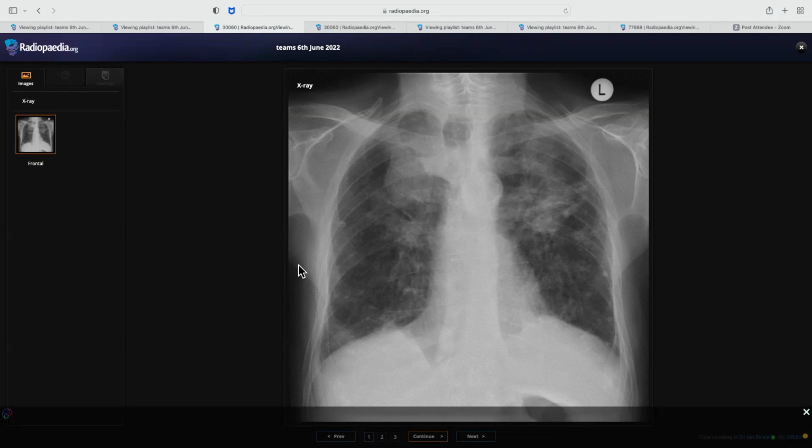So in summary, we have reduced lung volume with bilateral upper lobe ill-defined confluent opacities, and progressive massive fibrosis is a possibility. So I will correlate with the clinical findings of the patient, if he is a known case, to rule out exposure to occupational dust, and correlate with any previous examinations to see the progress of this case. I can also notice some tracheal dilatation, which denotes the chronicity of these findings. So progressive massive fibrosis is the most likely diagnosis in this case.